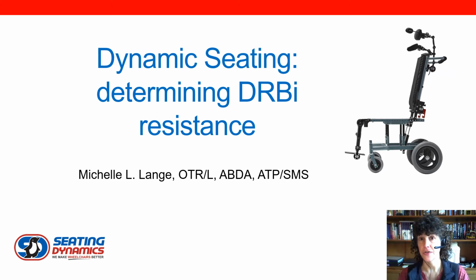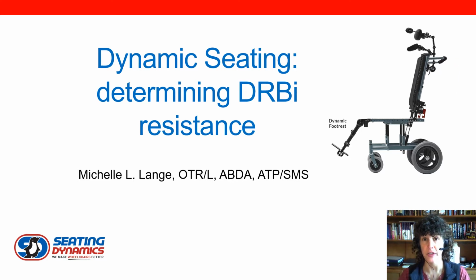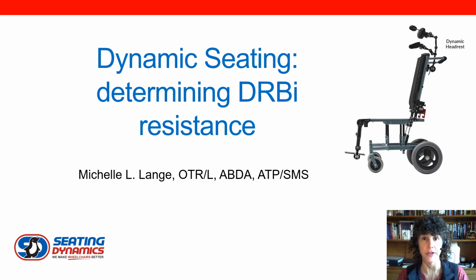In this series of 3 classes, we'll be discussing how to determine resistance of common dynamic seating components. Today we're going to start with a dynamic back, specifically the Seating Dynamics Dynamic Rocker Back Interface.